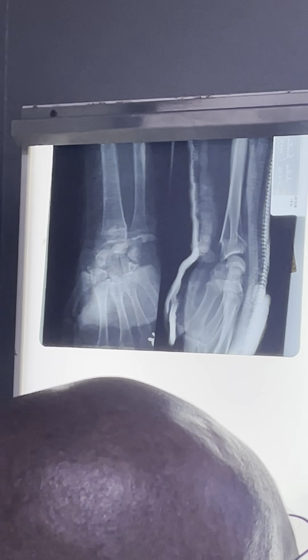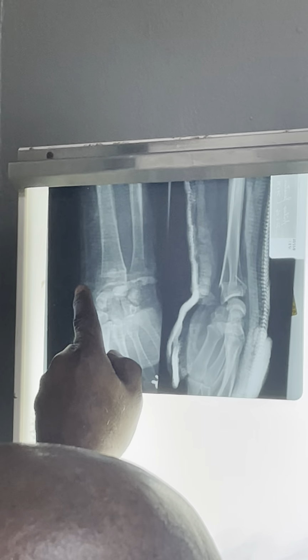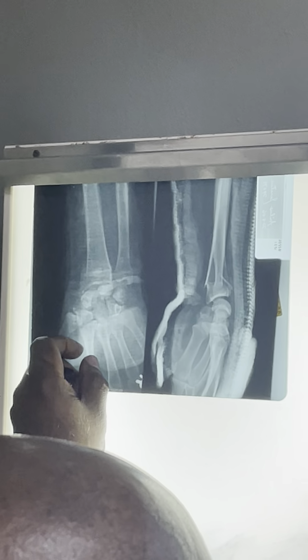In fact, let's look at this one, which is showing the lateral, because it's posterior and laterally shifted and tilted, right? So look at this one here now. See how it's laterally shifted over the thumb, the thumb side.